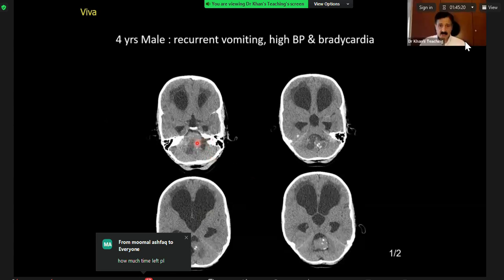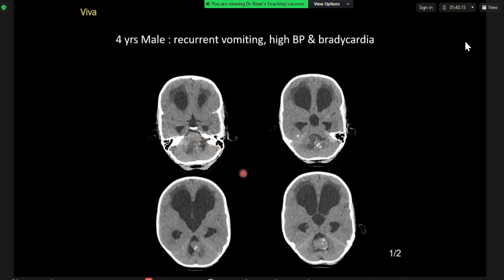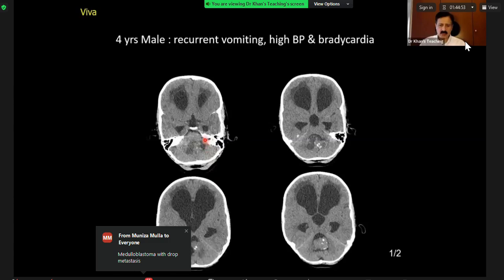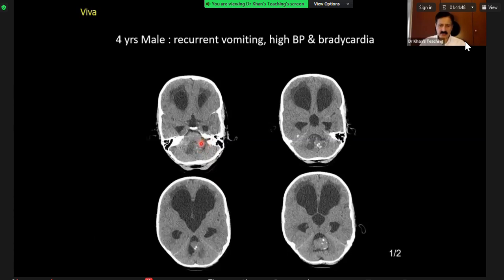What is happening here, where I'm pointing out? Trying to look at sequential. So it's a heterogeneous or maybe highly mitotic lesion that has got central areas of necrosis potentially, and areas of soft tissue, and then the areas of hypodensity. I am just trying to ask you, do you see this hypodensity here, like CSF? Yeah. The lesion is here.